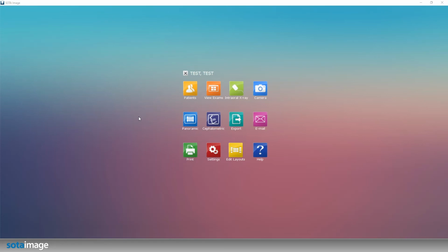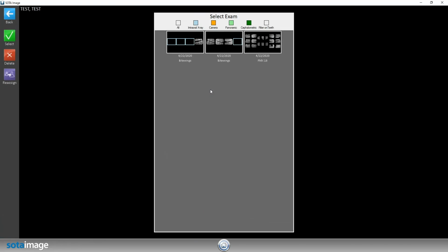In this video, I'm going to be showing you how to merge two exams together. So first off, what you want to do is have your patient selected. From there, go to View Exams, find the two exams that you want to combine.